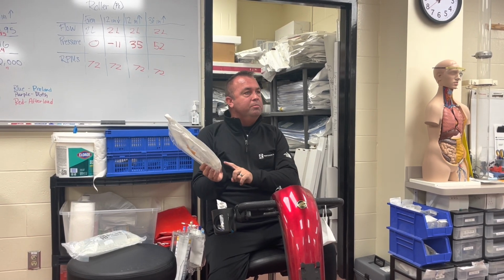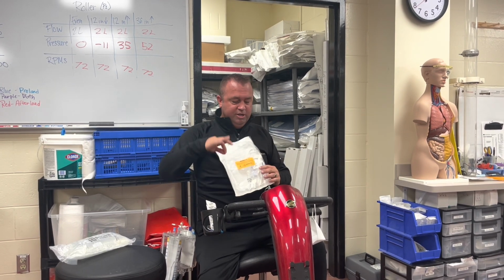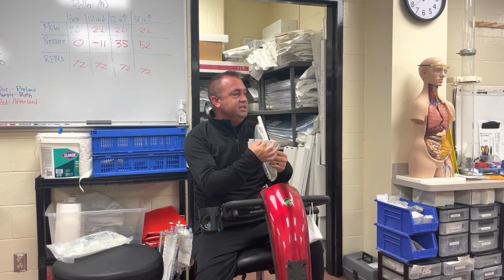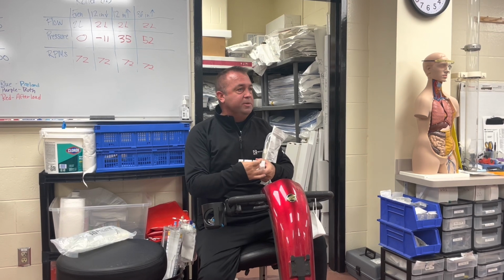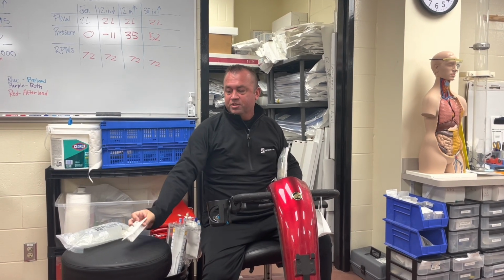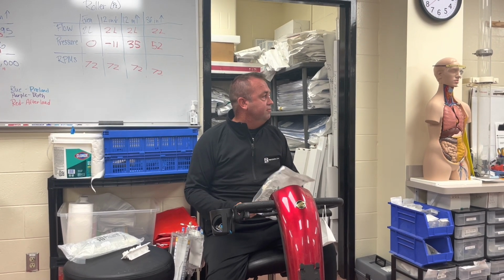Okay, what if we are measuring our radial pressure and then we need to put in a femoral line? Well, we can do 2 things. We can grab a single transducer, or sometimes I will jerry-rig it so they all come off the same pressure bag, and we actually have 4 transducers on our transducer clip. This one obviously only has a spot for 3. Most clips have a spot for 4, or some even 5. Behind Zoe over here, there's a clip with 4 different things, where you hang the transducers. So we can measure as many as 3 or 4 different pressures at a time, given whatever the heart and lung machine or the monitor is set up for.